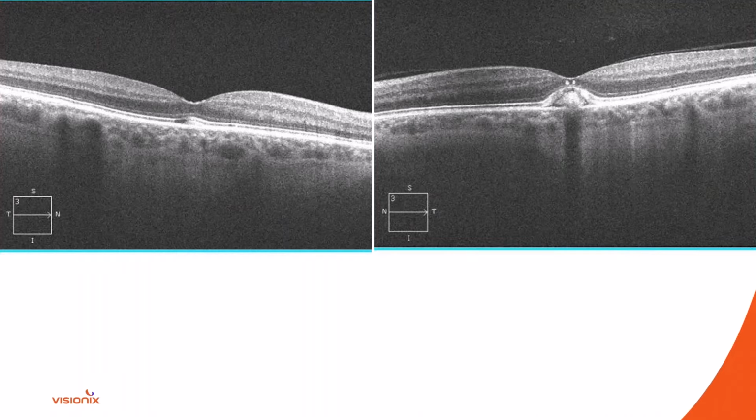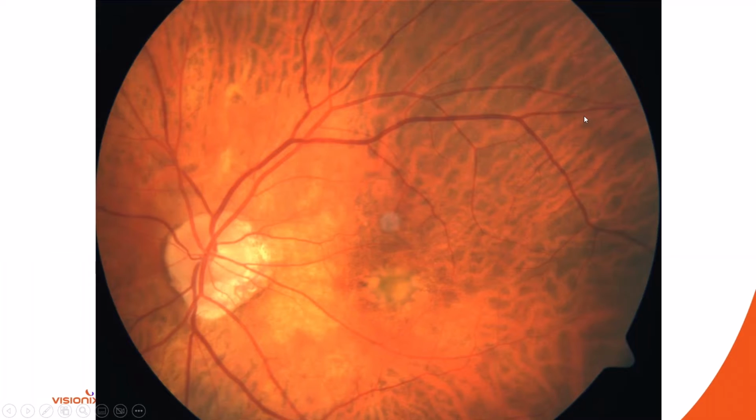Again, a hint, it's not macular degeneration. Here's the same patient again, right eye. You can see just a little bit of substance right here. There's the left eye, much more prominent in this particular patient. So here's a different patient, and you can see the left eye in this different patient here. And again, a hint, this is not macular degeneration, even though we've got some pigmentary changes.